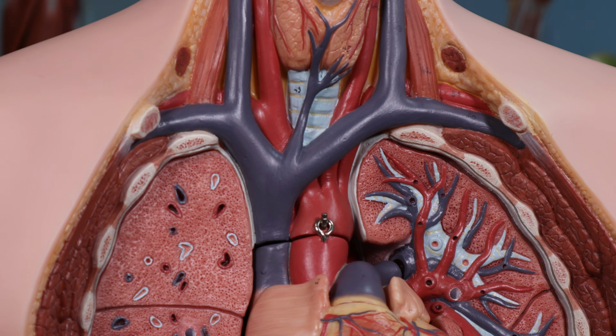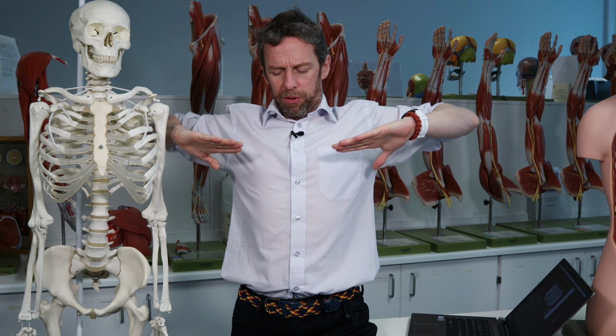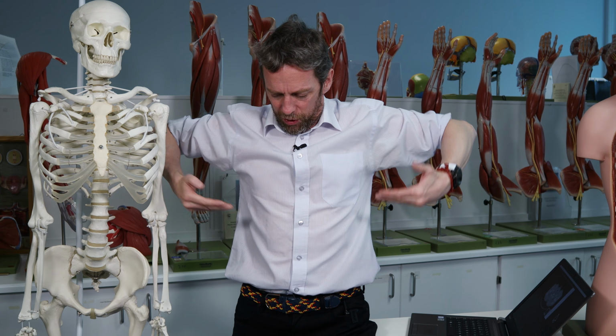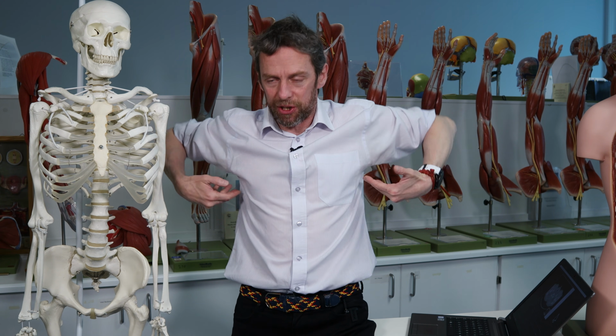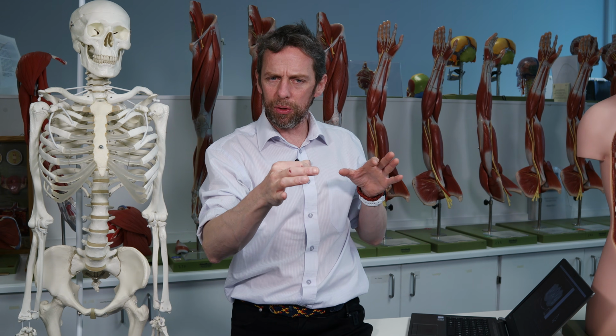The thing here with anatomy is that we've looked at, and I've got a model there, we've looked at the structures in the thorax in the model. If we're looking at transverse axial sections of the body, it's a good little exercise for our brains to try and work out what is that circle there?